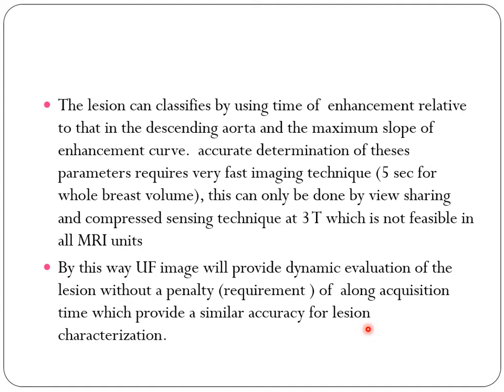This way, the ultra-fast image will provide a dynamic evaluation of the lesion without requiring a long acquisition time, which provides similar accuracy for lesion characterization.